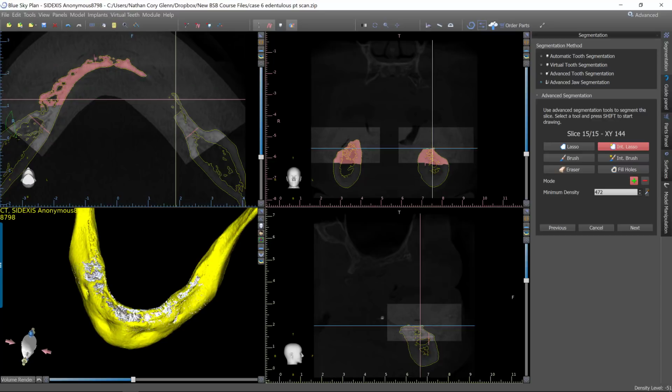Also define in the exact same slice here. Okay, so I've added more data to there, and I could even come back and maybe define another slice or two that I know it didn't capture. So you can analyze this data based on those outlines. Where did it miss? What can I go back and add? And if you need to in certain areas, you can come back and add it before you finalize that segmentation.